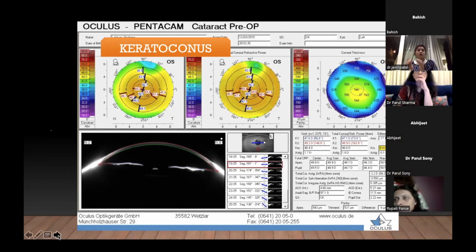Why do you want to use these values? Because the formulas are still suited for the older generation formulas, they are not yet incorporated. So your case has to be used like this. In this format, you do not convert it into the net power of the cornea.